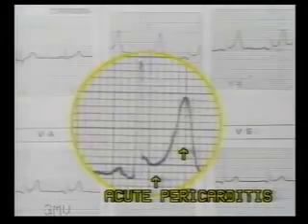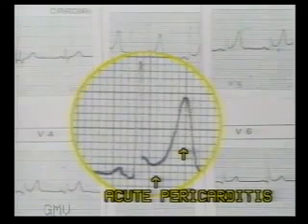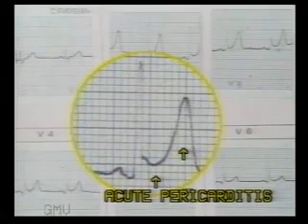The second cause of ST segment elevation is acute pericarditis. This ST elevation is concave upwards with upright T waves. So it mimics hyperacute phase of myocardial infarction, and even clinically the pain is identical. But pericarditis is a diffuse process.